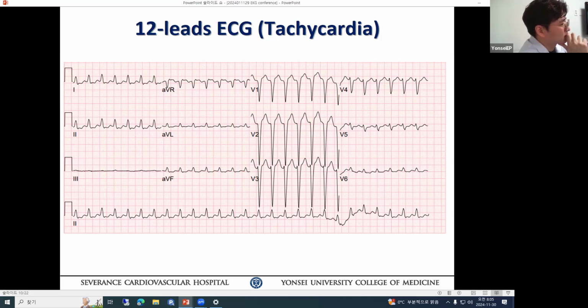Although, if it were a pacemaker tachycardia, you have to have an upper rate for PMT, right? And this tachycardia, because of how fast it is, you do not program this fast for the patient unless you have a specific reason for it. And you don't see ventricular pacing. So that's why I exclude that.